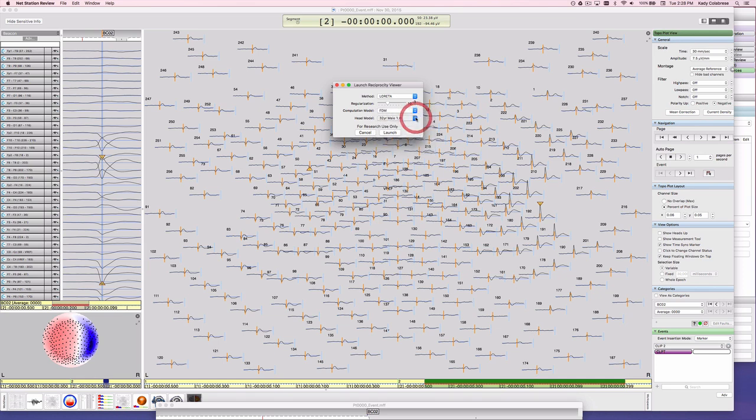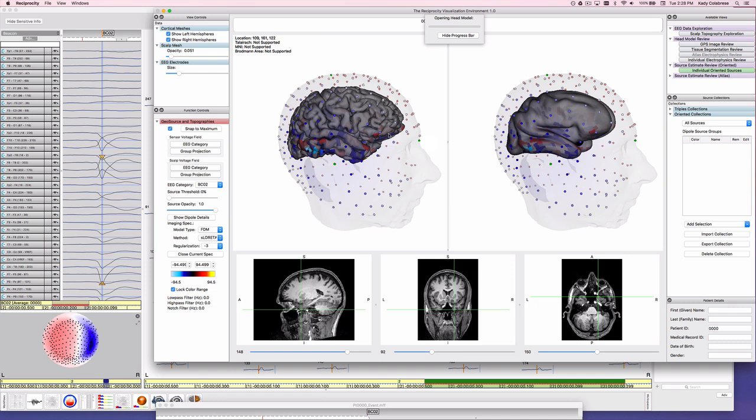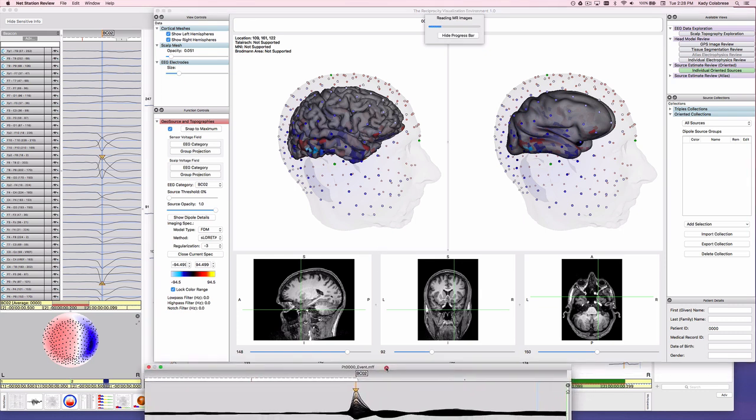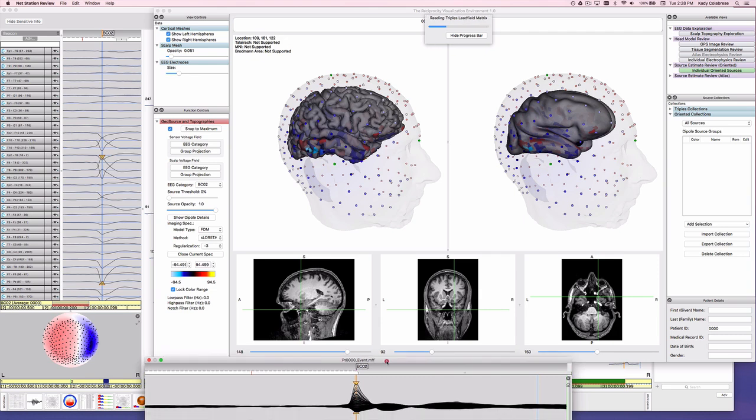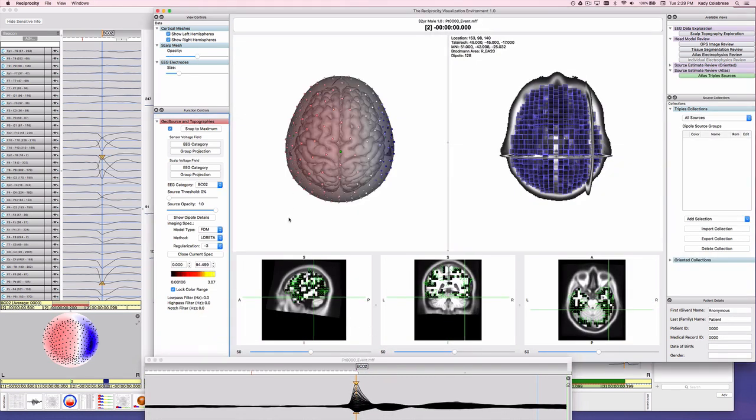The Atlas models will visualize the source results in a different way than the individual model. In the individual model, the orientation of the dipole is already described, regardless of what EEG data we put into the model. Therefore, we can use one color palette to show 2 things: the intensity of the current and the polarity of the potential field of the dipole that is projecting outward. Make sure to lock the palette.